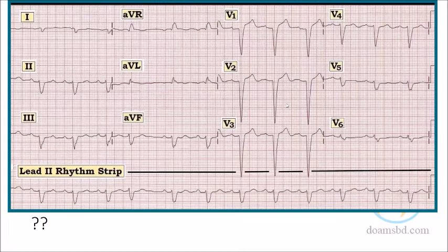Raise your hand. So block means where to look? Lead 1, V1, V6. So which block is here? Or intraventricular conduction defect? Ankit is ready. Ankit.